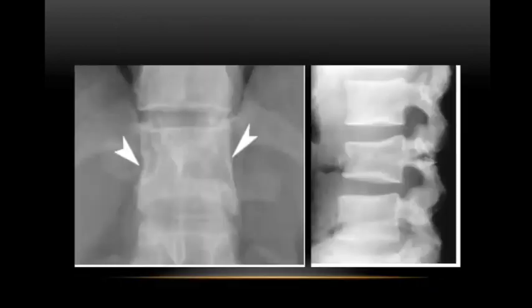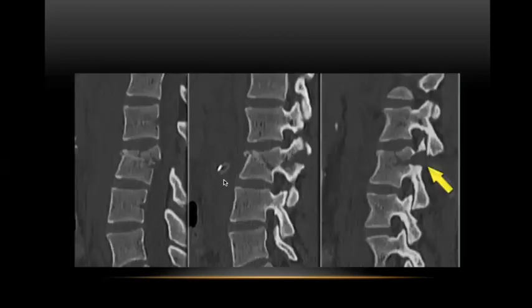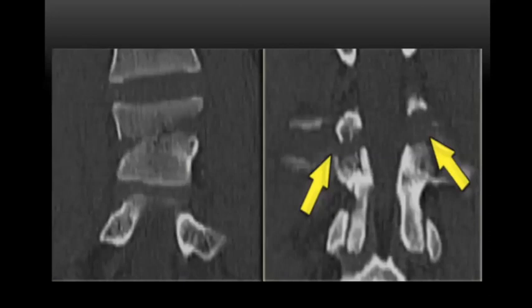All right, so again, fracture here, extending to the posterior element, and you have the separation of the posterior elements here. And you can see here there's disruption of this. I mean, you have a lucency inside here. All right, this one also, next example, and this is only a coronal view of CT scan showing from anterior to posterior.